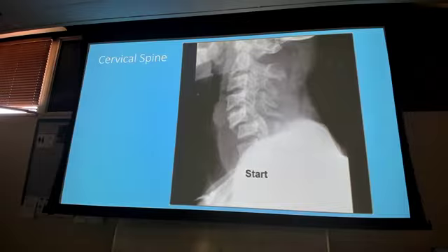So what do we got here? Spondylolisthesis. Okay, so in your head, don't do it out loud. Start counting. Try to name it for yourself. I'll give you about 15, 20 seconds to go through it. And then I will do it with you. All right. Base of the skull up here.